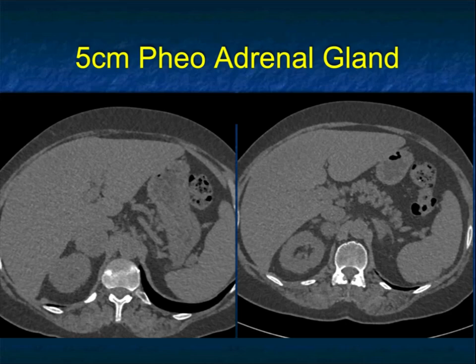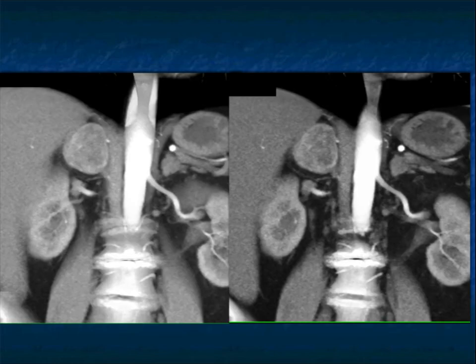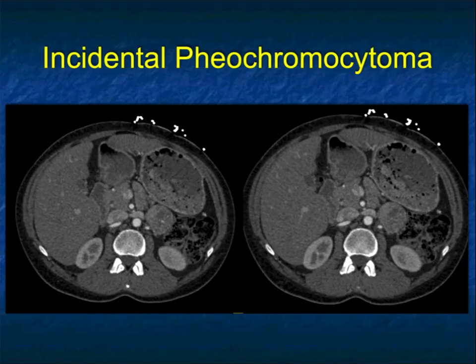Another example, look at the right adrenal, 5 centimeter or so lesion. Here you can see there's some vascularity, but I show you this case to make the point that this is where Pheos often become difficult. It's vascular, but not all that vascular, but it is enhancing above 130. So again, the same principle. There's a range of enhancement patterns in pheochromocytoma, and you have to be aware of that as you read your cases.